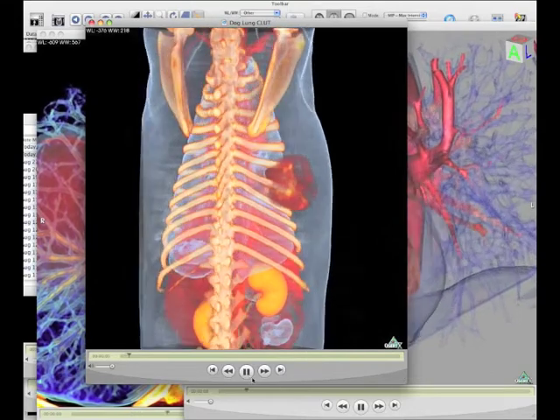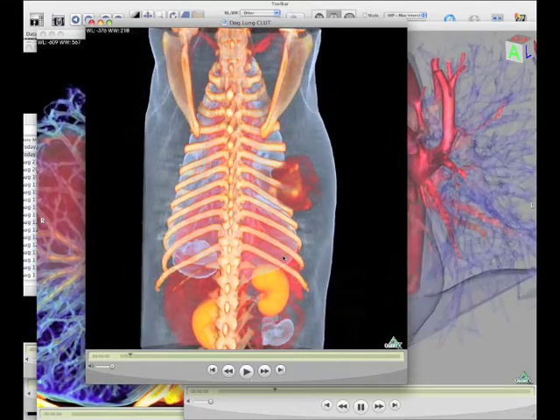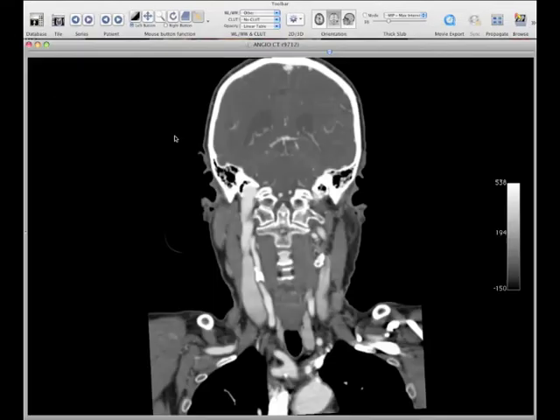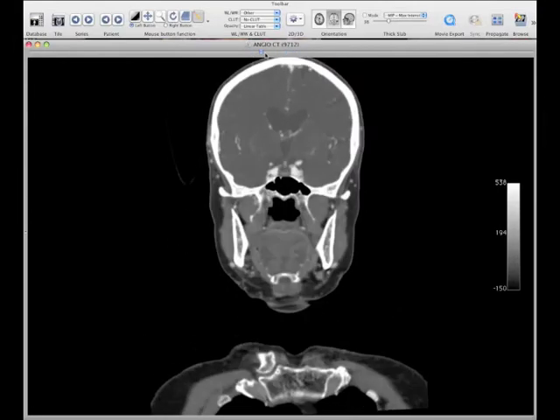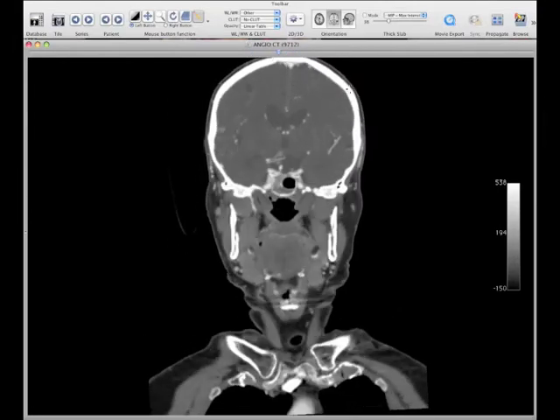these are all data sets that are available on the Osirix website. What Osirix allows you to do is to go through on a grayscale image like this. Right, so this comes as it comes from the CT scanner. There's a series of slices, and we can go through and assign color values and ranges to these different levels of gray. This isn't perfectly white, this isn't perfectly black, they're ranges of gray, and we're going to go through and assign values to them.